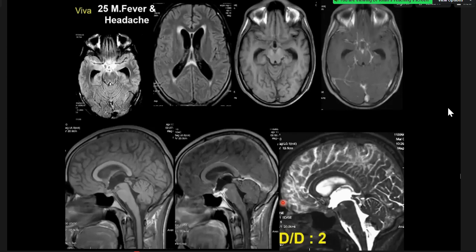I can also see hydrocephalic, supratentorial hydrocephalic changes. I can see also high FLAIR signal intensity, bilateral symmetrical, surrounding the frontal and occipital horns. Excellent. Conclusion? Conclusion is basal meningitis, maybe tuberculous meningitis, maybe pyogenic meningitis complicated by hydrocephalus.